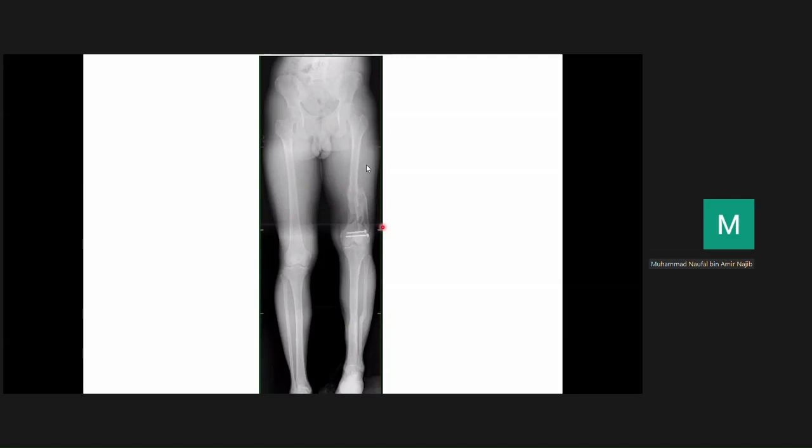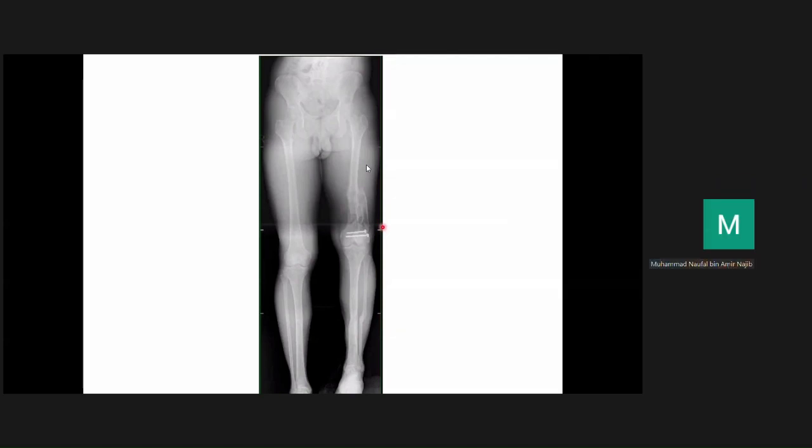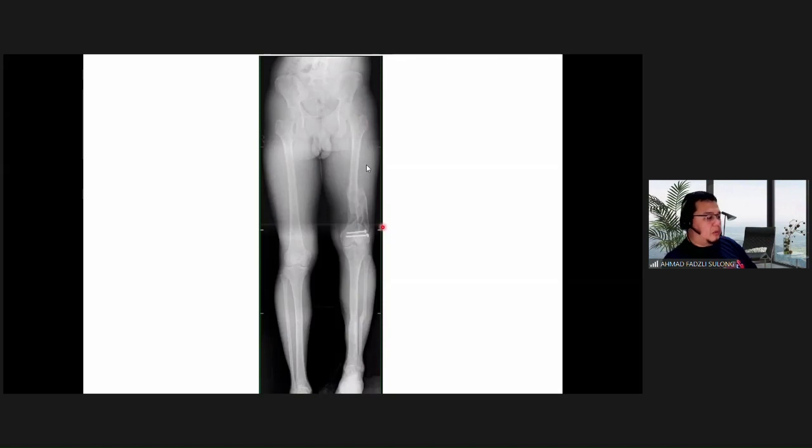What deformity that you see, right? You only told me one deformity, which was the shortening, right? Okay, good. Any other deformity that you can see on AP and also lateral? Okay, AP apa? Ada tak? So this description of X-ray holds true for any trauma X-ray, okay? This is a complication of trauma.